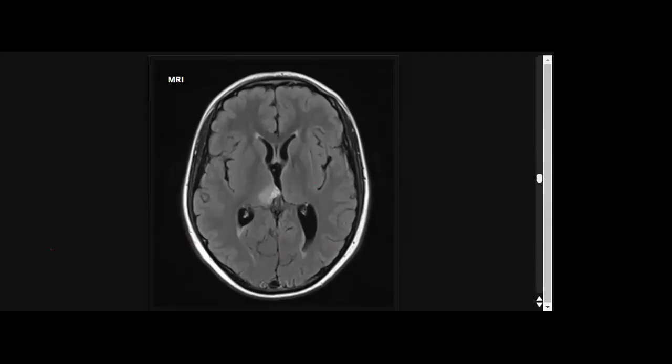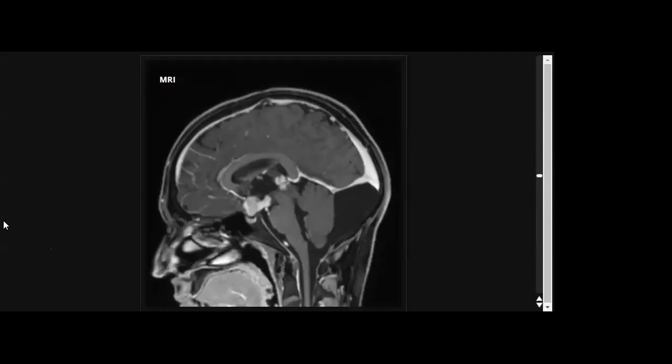Can I have a look at the sagittal post contrast sequence, please? Give me two differential diagnoses that may cause this pattern. Germinoma could be coming, yes. Suprasellar and pineal. Good. Other differential?